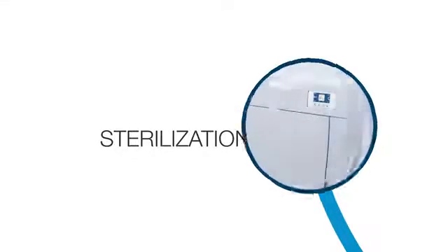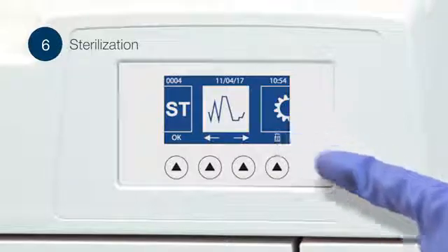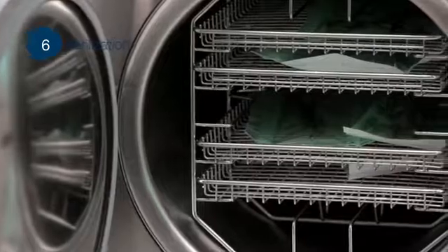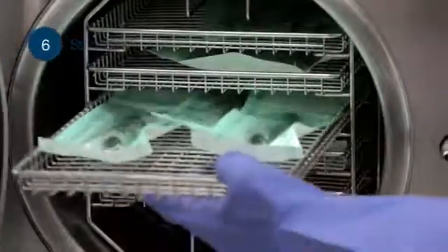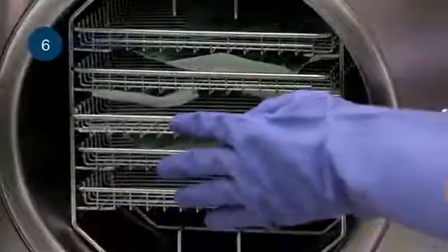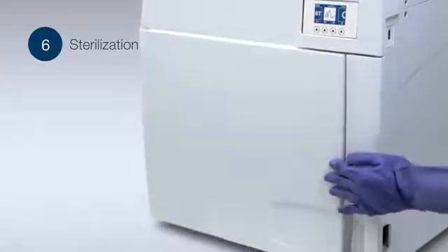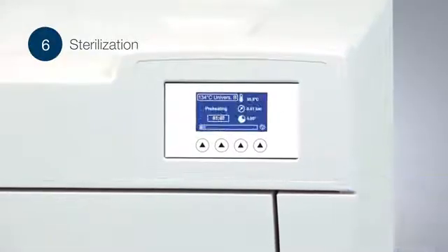This is the pivotal step of the entire process. Instruments which have undergone sterilization are considered sterile and ready for further use. Staff must always select the correct sterilization cycle.